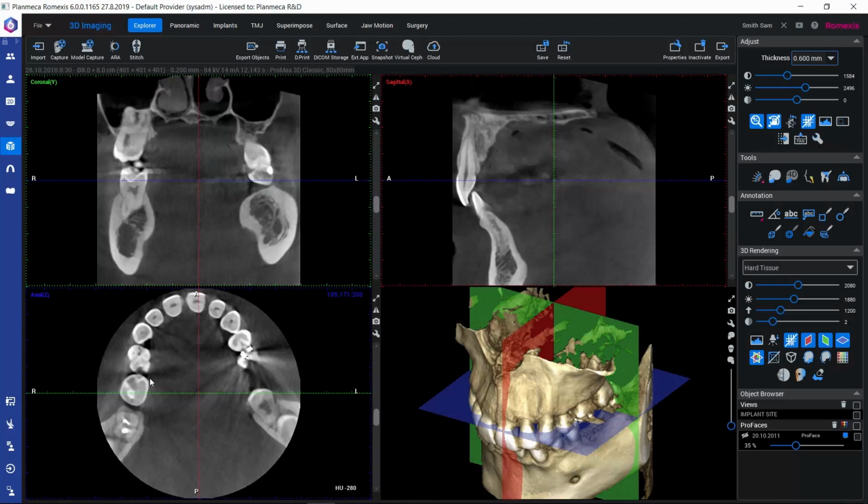at the same time. If instead we would like to adjust the slice thickness for one of these views only, we could open these viewport settings that we can find next to each of these slice views. So this small wrench-like icon, we could open that and use this slider here for the slice thickness for each individual slice view, coronal in this case.